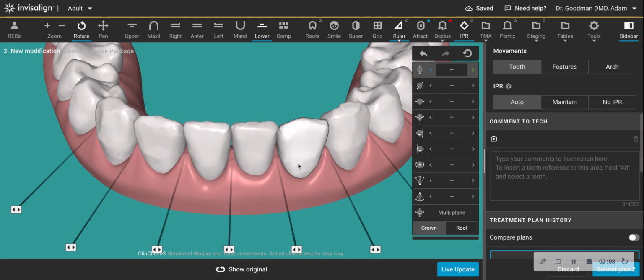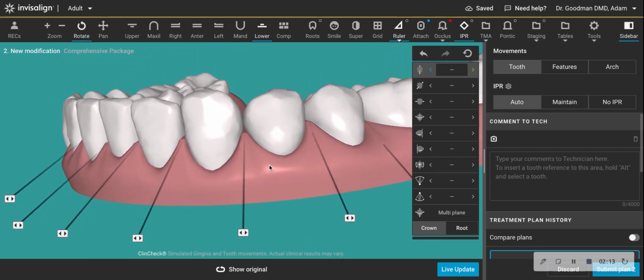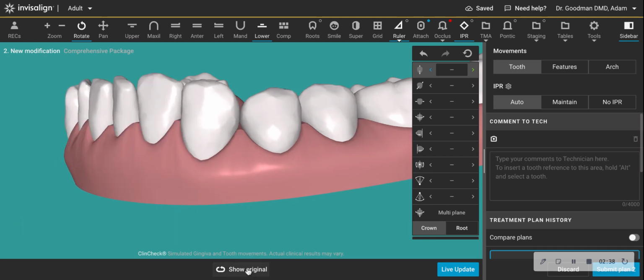And I'll tell you the clinical significance of this, but I want to show you one other thing as well. Here is the starting position of the canine. I had said the lower incisors are crowded, and I say retroclined or upright. I don't have a ceph to show you, but I think you can notice that they are more upright. And there's a bit of a mesial root inclination on that lower left canine. And in the final position, that root angulation is improved more to the normal. However, this would represent what a cinched arch wire might do, where you're preventing mesial movement of the crown.